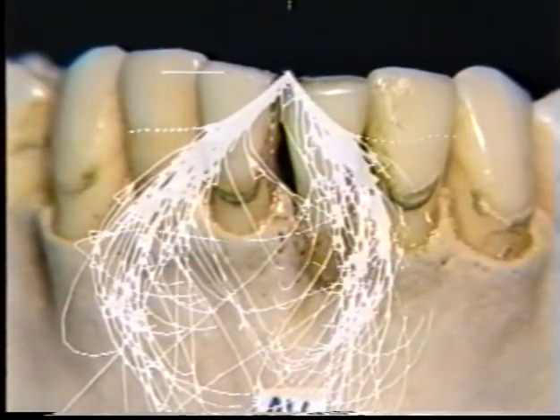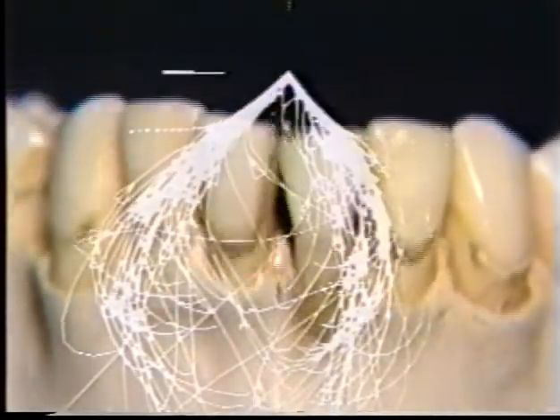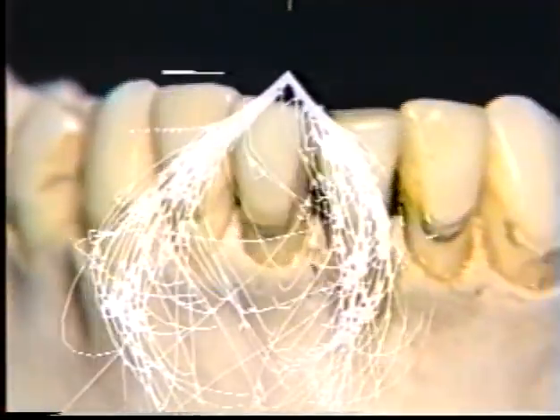In this demonstration, you have seen that the typical chewing pattern of an adult with good occlusion is characterized by midline opening movements, wide lateral closures, frequent gliding tooth contacts, and a pause in the intercuspal position. Condylar movements during chewing are shown to reach their borders, which are simulated by articulators. You have also seen an example of a subject with extremely worn teeth and excessive lateral movements in the joints.